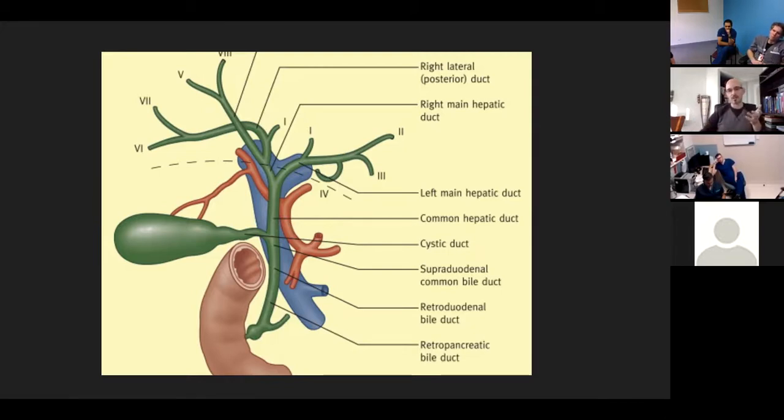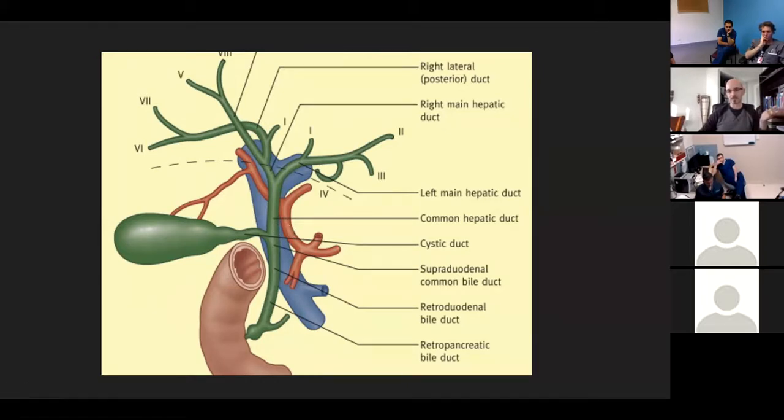And as you can imagine, if you are looking at the hepatic artery on top of the portal vein instead of the CBD, and you think that it's the CBD and you measure it, it's going to be the normal size for the CBD. And your real CBD might be completely dilated.